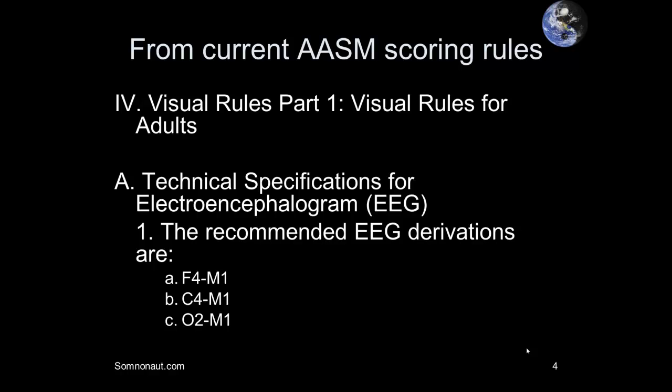I find that many people incorrectly display both left and right EEG channels during scoring. This forces them to accrue slow wave activity across the two channels, the two frontals, and that's not the way it should be. Not only that, I also see people accruing slow wave activity across frontal and central derivations. This also is not the way we're supposed to accrue slow wave activity.